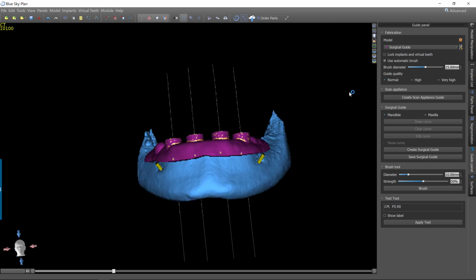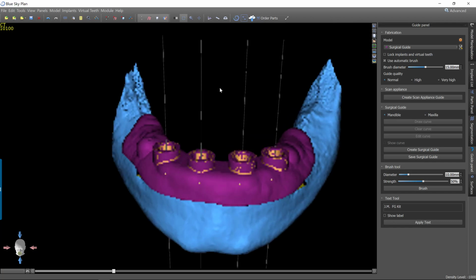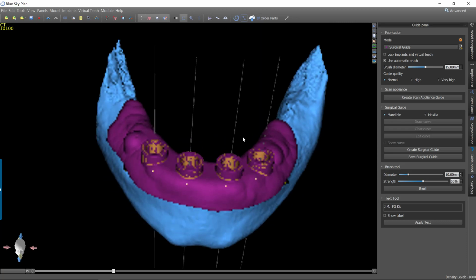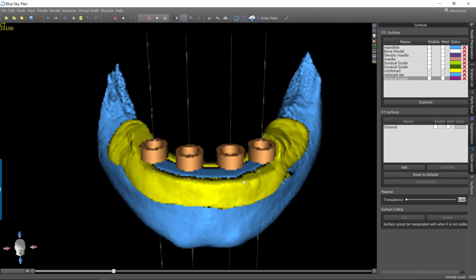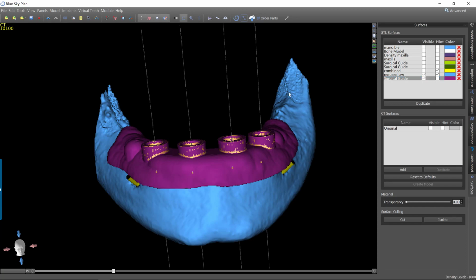So unlike some of the other techniques which would use a stackable guide, that's certainly possible, but it's actually a patent protected process. With this method, what we're going to do is just make an individual bone reduction guide, which would be the yellow one, place that on the mandible, table it down to even with these edges, and then that guide comes out, and this one will go on, and this one will only fit after that proper reduction has been accomplished.